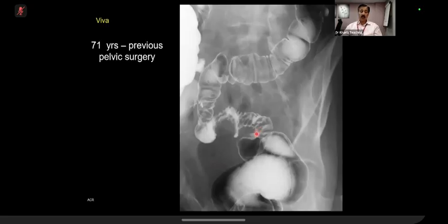And there is a sign in old radiology which we call the striped colon sign. So these mucosal folds become fixed there. So this is a film of metastasis from ovarian carcinoma.